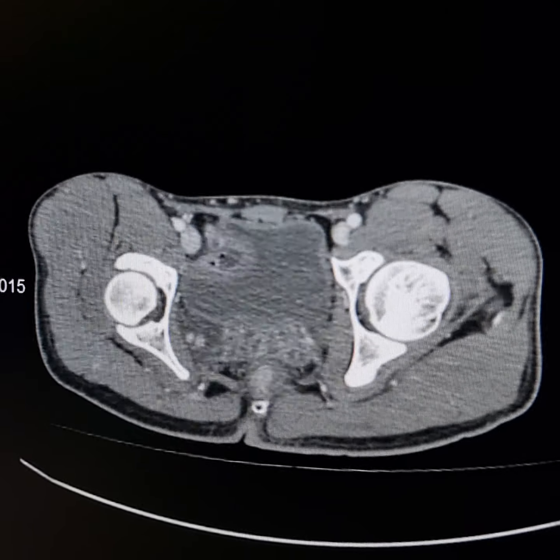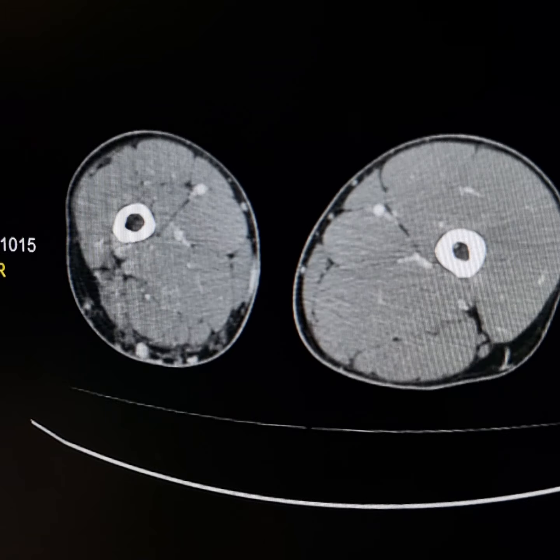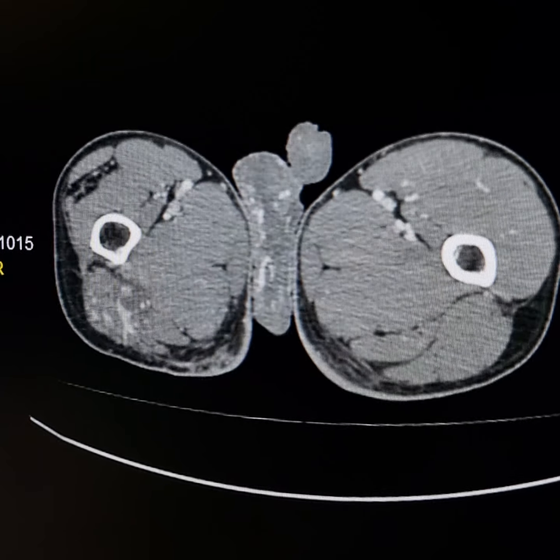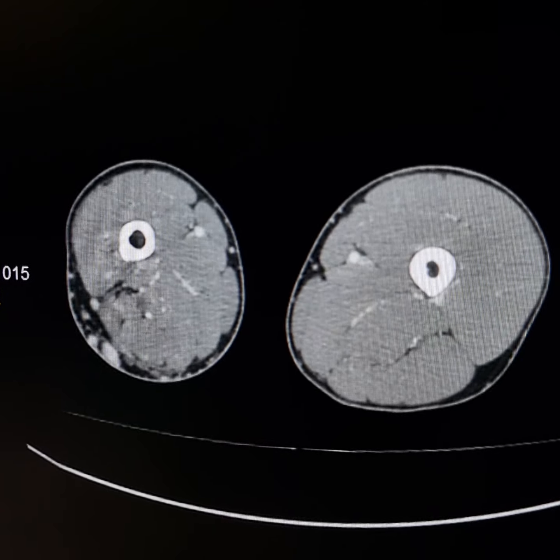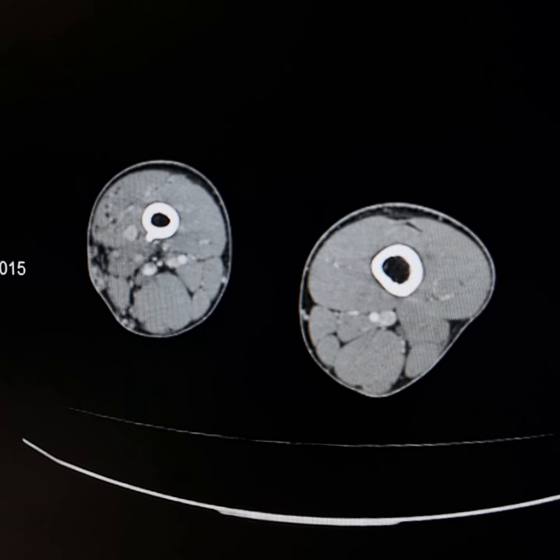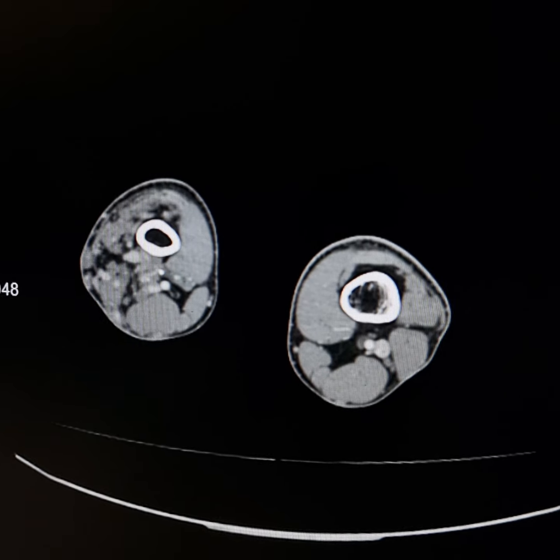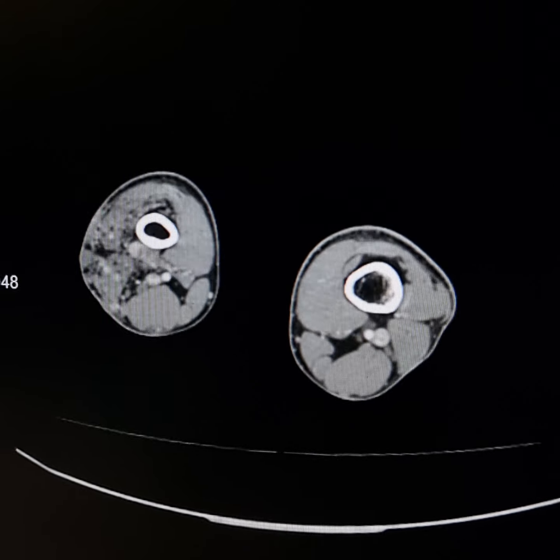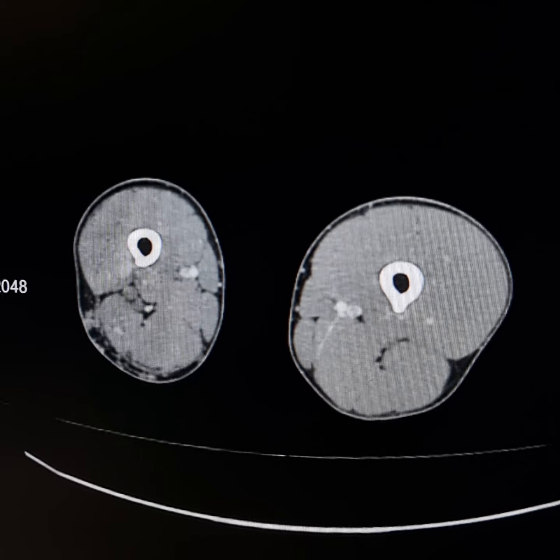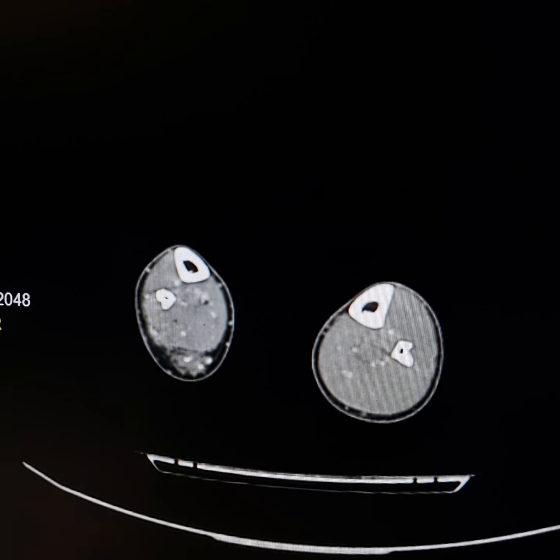So there are multiple venous angiomas, and there is typical muscle atrophy, fatty infiltration, and a reduction in the girth of the lower limb. In cases of Klippel-Trenaunay-Weber syndrome, there is leg length discrepancy. The diameter of the leg is increased and the limb is longer as compared to the other healthy limb.